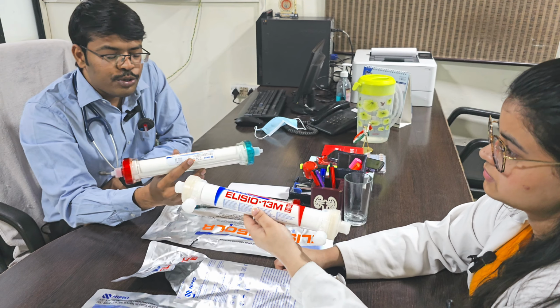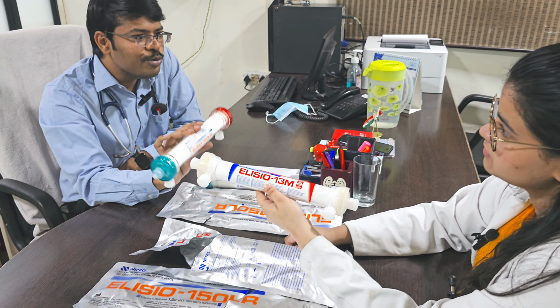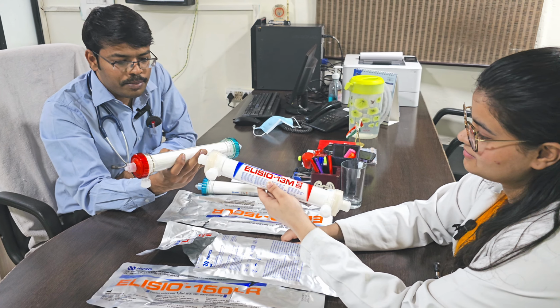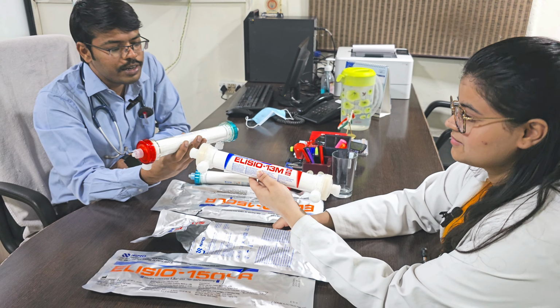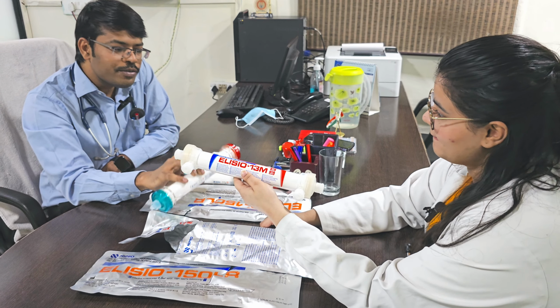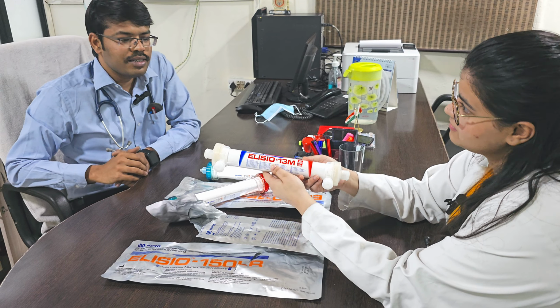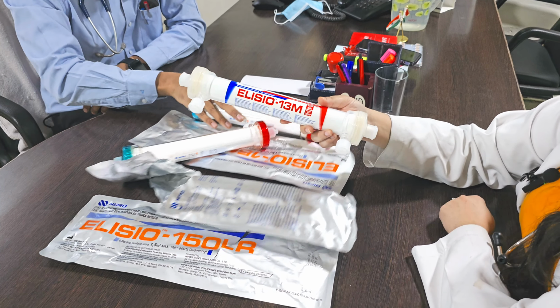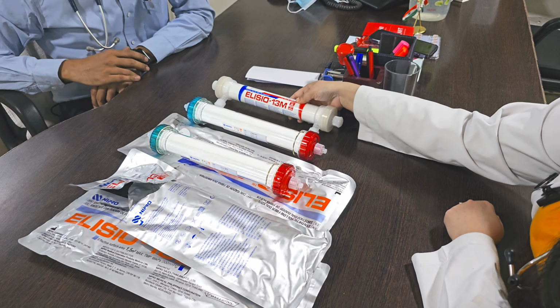And do you know regarding fiber bundle volume? No. So these kinds of questions, once you answer all the preliminary questions, probably the questions will take you to fiber bundle volume. I hope even if you answer your preliminary questions, at least for your spotter, that will be more than enough. So these are the dialyzer, various types.